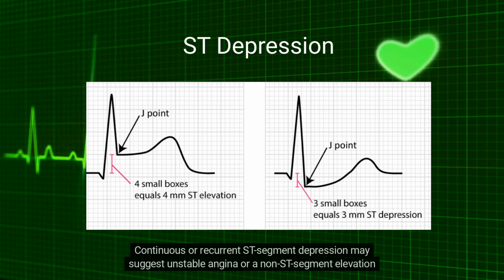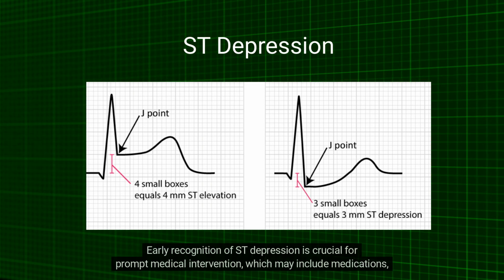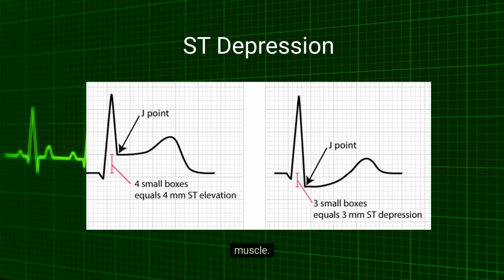Continuous or recurrent ST segment depression may suggest unstable angina, or a non-ST segment elevation myocardial infarction, NSTEMI. Early recognition of depression is crucial for prompt medical intervention, which may include medications, lifestyle changes, or invasive procedures like angiography and angioplasty to improve blood flow to the heart muscle.